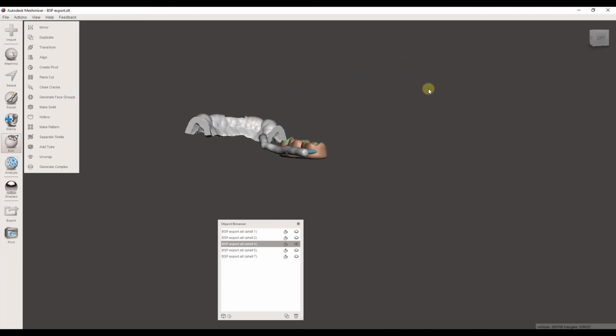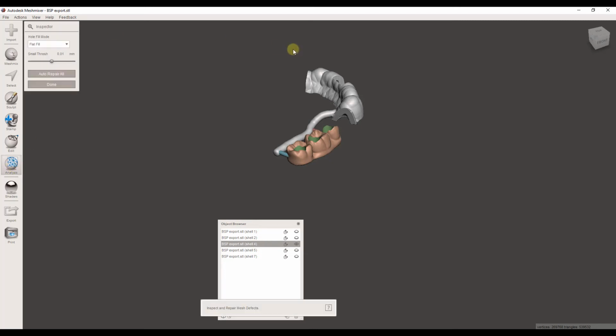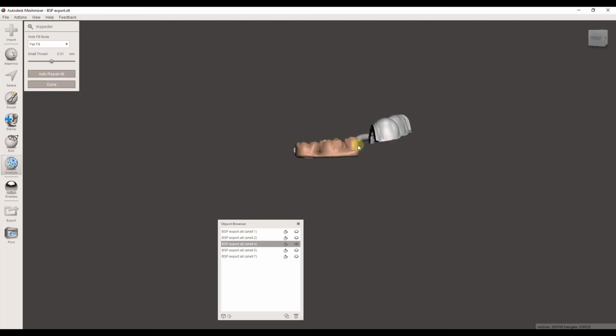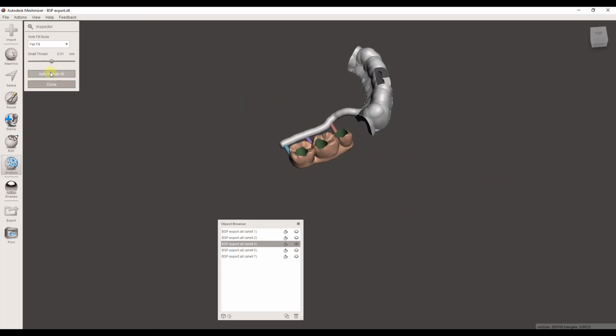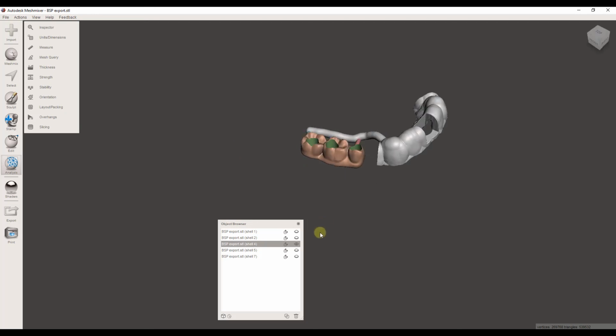And you can export this for 3D printing, and one good thing to do is analysis here. Before you export it, choose this analysis and then inspector, which you'll see these little globes or balls or spheres that attach to this if you have errors, but there's none here, so that's good. But I'll click Auto Repair All and done. So then we're able to go over here to this export at the bottom to export that for 3D printing.